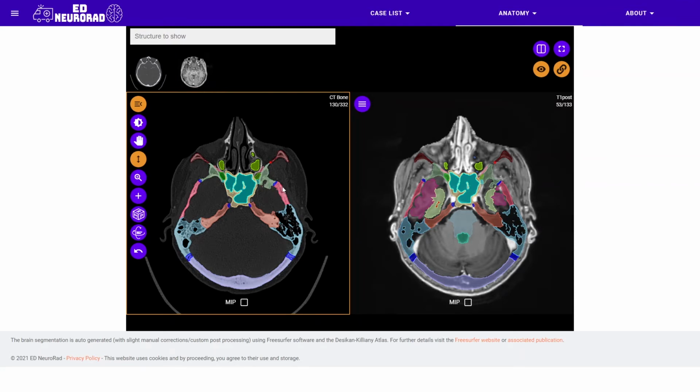When you first load them up, you see all these different colored annotations describing what different structures are. This user interface is inspired by what Head, Neck, Brain, Spine used to look like. And when you hover your mouse over a particular structure, here in the bottom, it will tell you what that structure is. So for instance, mastoid temporal bone here. This will be the petrous portion of the temporal bone, etc.